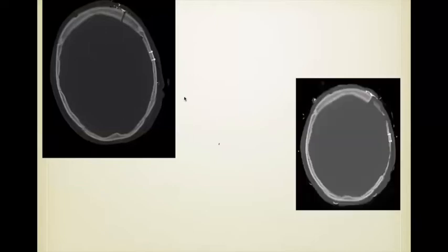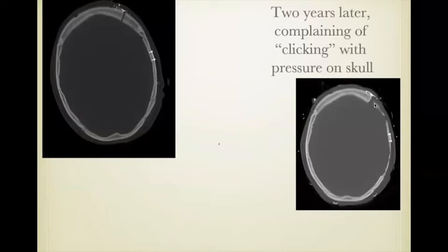In another example, relatively large craniotomy flap. Here it is sometime later. Now we're 2 years later, and the patient is complaining of clicking of the skull. They roll over in bed and they hear a clicking noise. This is one of the complaints that patients will report.